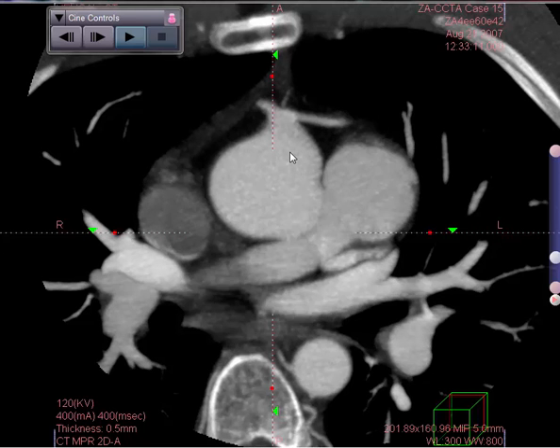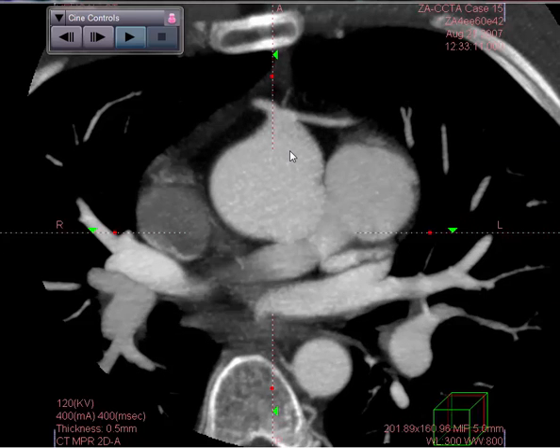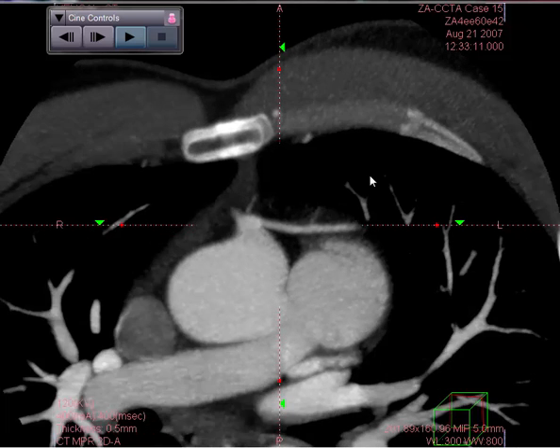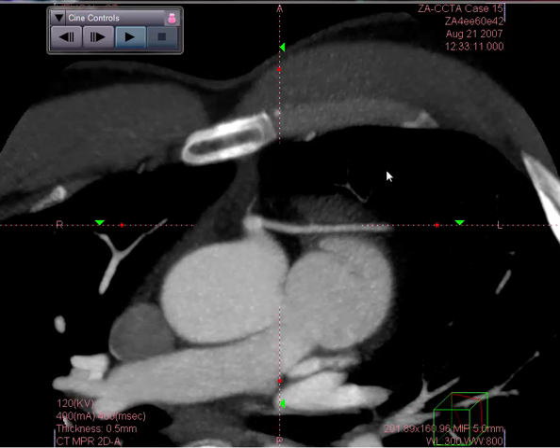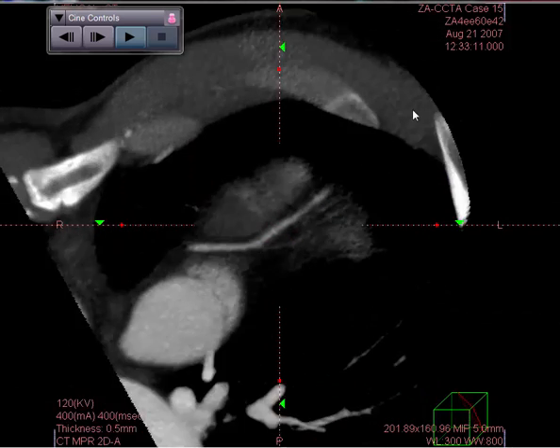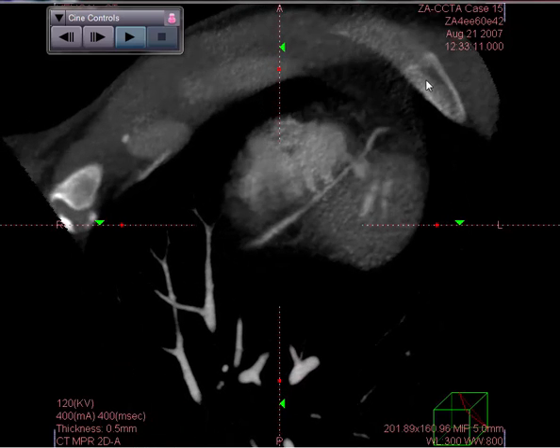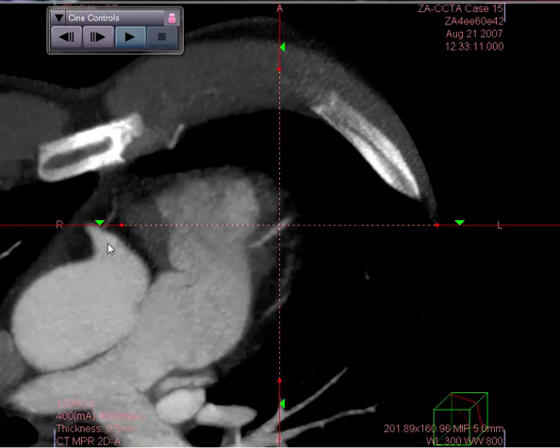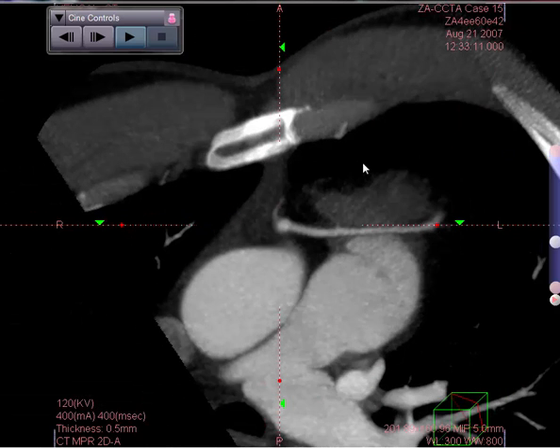So this is very common in a situation of congenital coronary anomalies, and you can see here that there is a separate ostium and then there is a separate vessel coming off here, passing anterior to the pulmonary artery and then proceeding in a normal anatomic course for what would be considered the mid and distal left anterior descending coronary artery. Get back to the origin here.